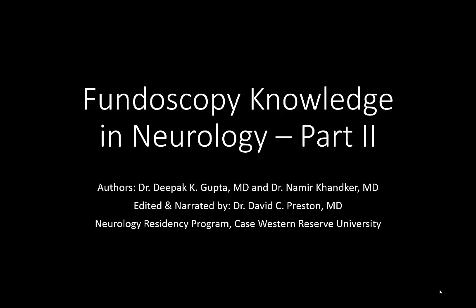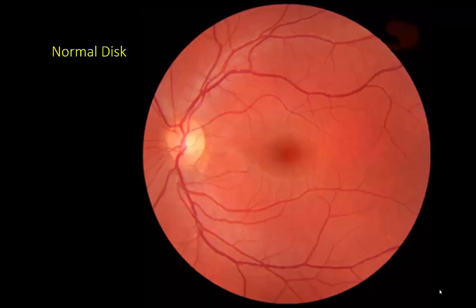In Part 1, we talked about the anatomy and physiology of the optic fundus, how to use our ophthalmoscope, and some aspects of the normal fundus. In this Part 2, we'll review the normal fundus, and then we'll go on to look at abnormalities that every neurology resident needs to understand. So let's look again at the normal fundus.